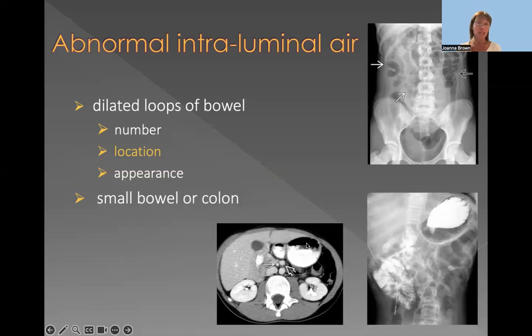Because the child presented with acute abdominal pain, and this was in the middle of the night, the adult radiologist did a CT, and you can see here the inversion of the position of the superior mesenteric artery and superior mesenteric vein. This happened in the middle of the night when we didn't have a pediatric radiologist. This is why the CT was performed.